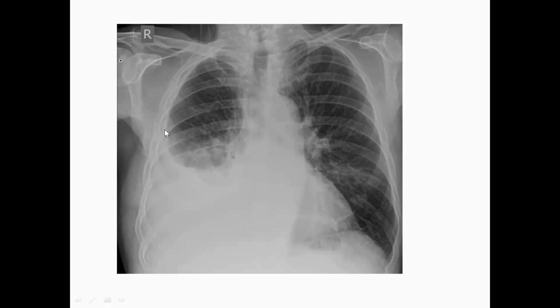Maybe you've heard about the meniscal sign. At the top of the pleural fluid, there is a meniscal sign. What's the meaning of meniscal sign? It's a cardinal sign that this homogeneous opacity is a pleural effusion. If you see here, at the top of the pleural fluid, we see a concavity, gently sloping down from laterally to medially, like this. So this is the cardinal feature of pleural effusion.